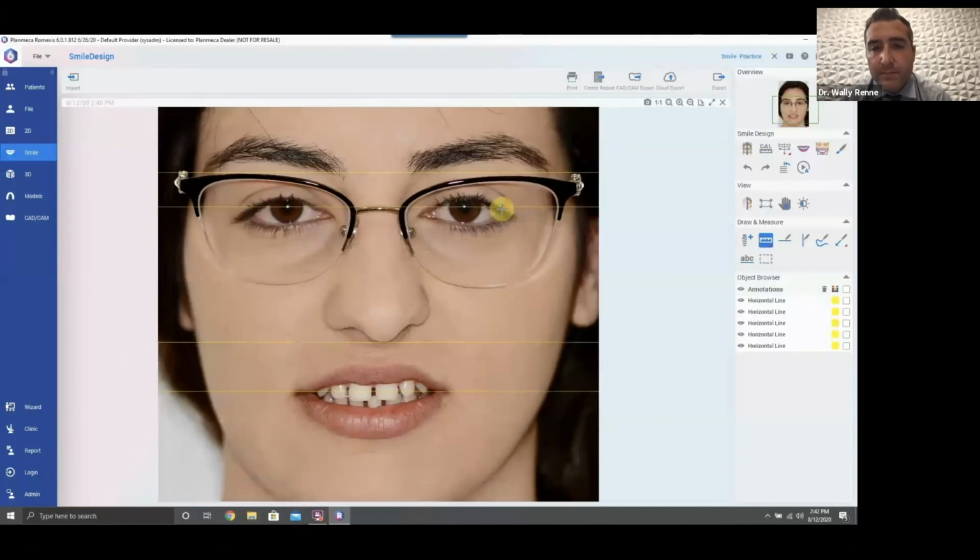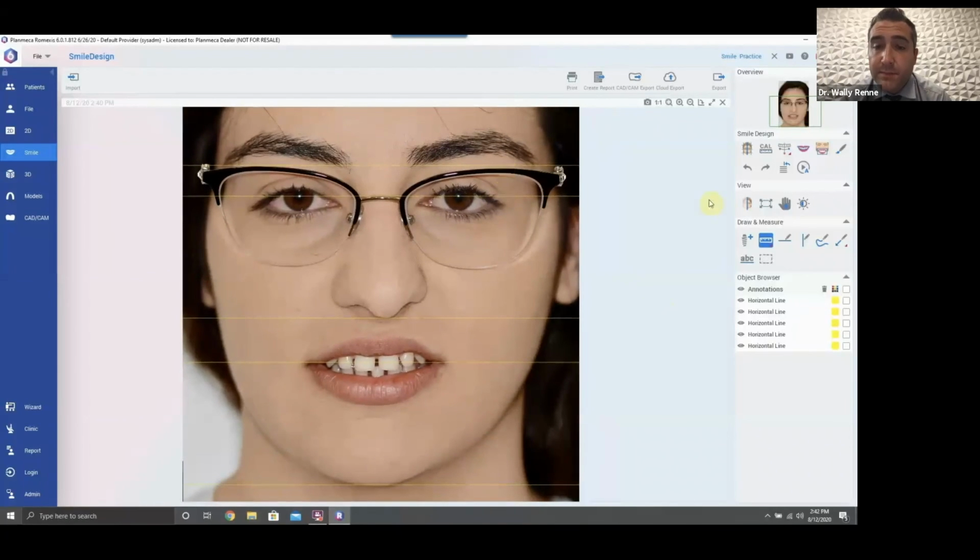And so I'm gonna go ahead and measure the facial thirds, and I'm gonna start with the midface. Now the midface is from soft tissue glabella to subnasally. Okay, and so here we're dropping a measurement of 61.7. Okay, and the number's not important so much as the ratio. So now we're gonna measure the lower face. So it's subnasally to soft tissue menton, and we're at 66.